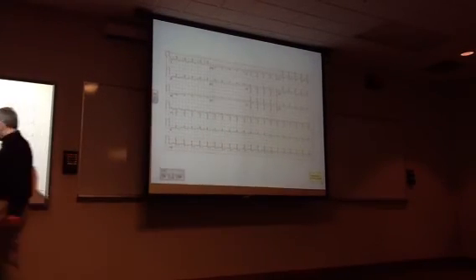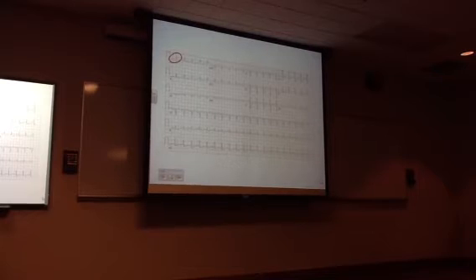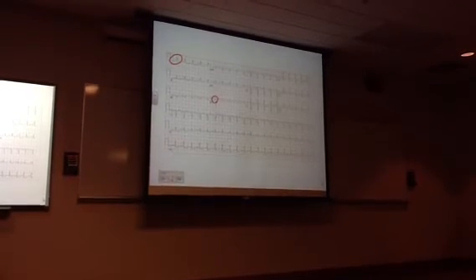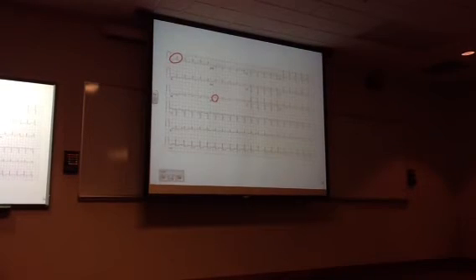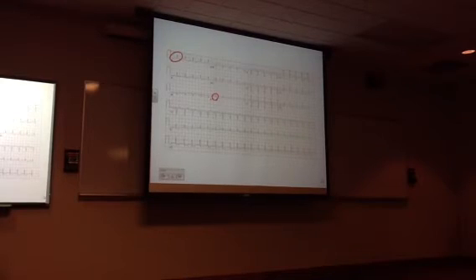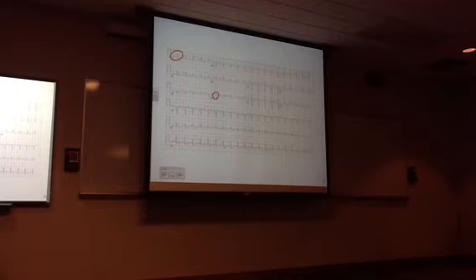Potential changes in lead one are upright, positive. So I'm out this way, right? Lead one is positive leftward, negative on this side. Now look at AVF. Not quite as impressive a positive potential change in AVF, but it's still positive, right? So most of my vector is going toward lead one and not so much toward AVF. So my axis is somewhat up here, but still in the normal quadrant. So he doesn't have any axis deviation. He's heading toward lead one more than AVF, but he's still in a normal quadrant. So there is no axis deviation. That would be a normal axis. All right, good.